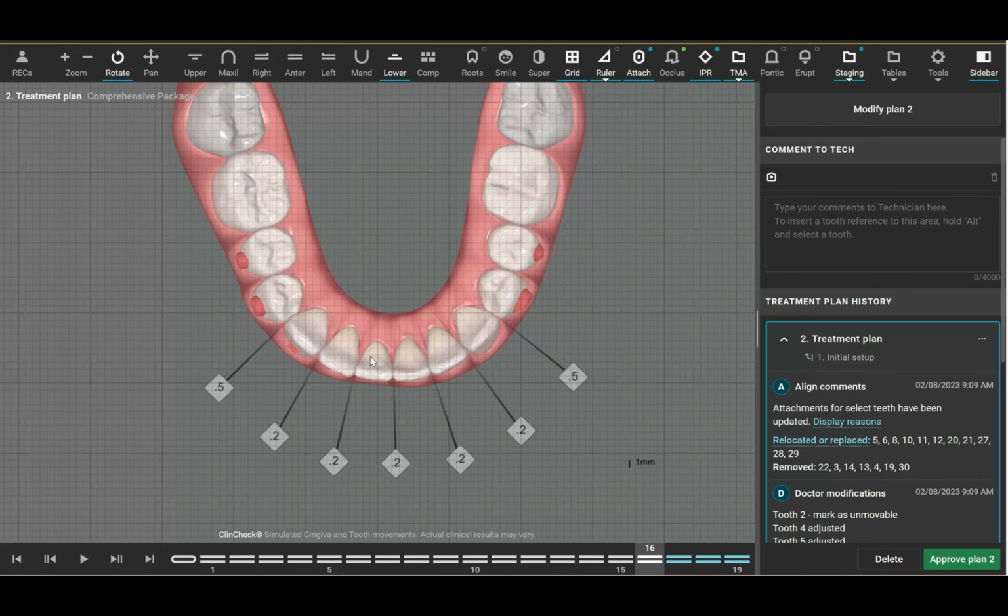So this is how you can take a case where you're concerned about alignment, you're concerned about forward movement of anterior teeth, and you want to limit that forward movement so that you don't develop gingival recession issues. I hope this video is helpful for you.